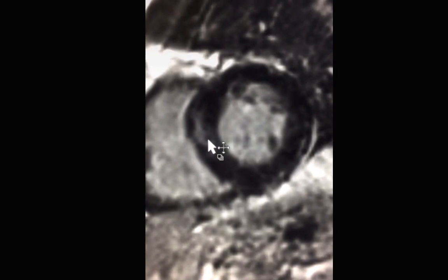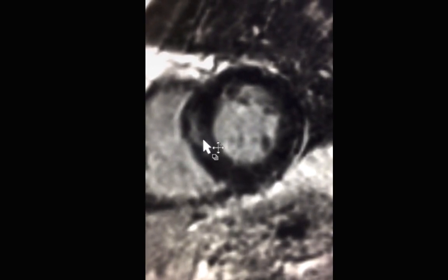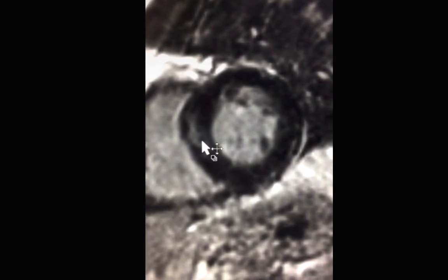With acute myocarditis, for example, from a viral infection or a drug reaction, the presentation would be more dramatic. Typically, those patients would have normal coronary arteries but would have elevated cardiac enzymes. This patient's presentation was chronic and different. The patient had arrhythmias and heart block, and this favors sarcoidosis.